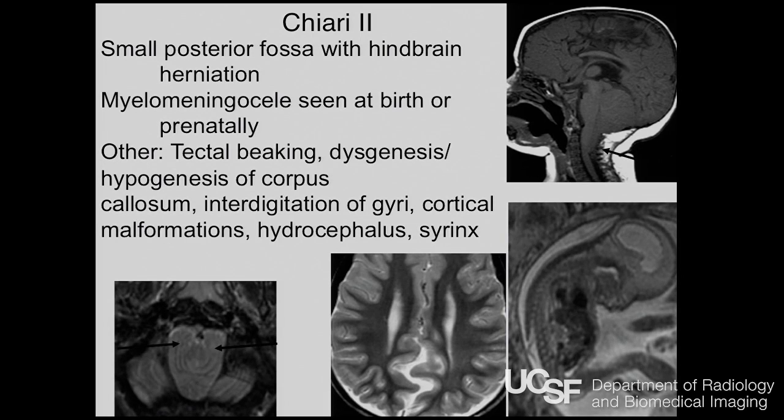Chiari-2 malformation also is characterized by a small posterior fossa, but the small posterior fossa in Chiari-2 malformation is because there is a large CSF leak that has occurred in utero, and that's because the bony elements have not formed. You have an abnormality in the development of the spinal canal, leading to free communication of CSF with the amniotic fluid. And this essentially results in an intracranial hypotension picture in utero, which explains why it looks like this when we image them as children.